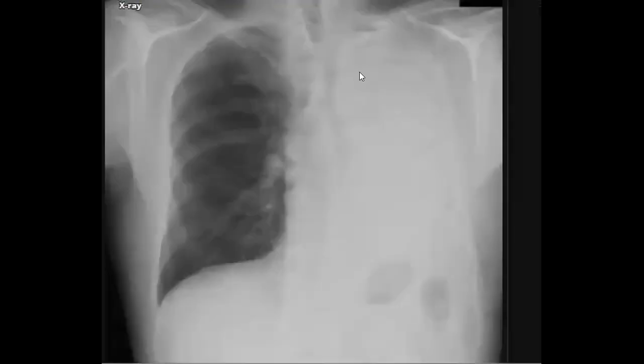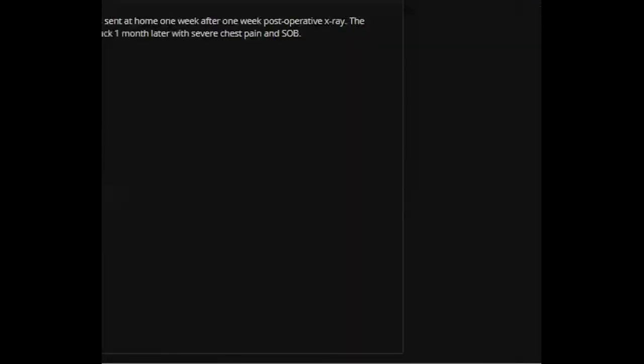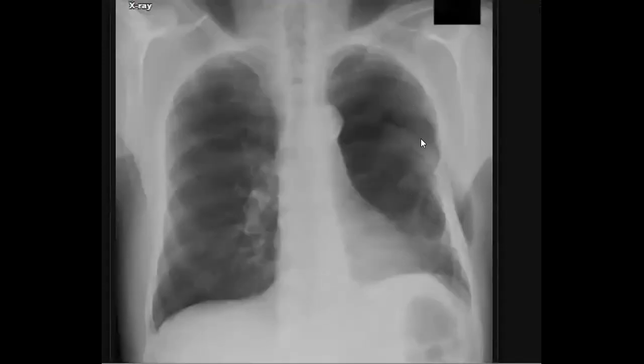So if you find increasing air in a short period of time, this means this complication is not a good thing. He already has a rib fracture, and also a pneumothorax and some effusion, so all this indicates that this patient has bronchopleural fistula as one of the post-operative complications.